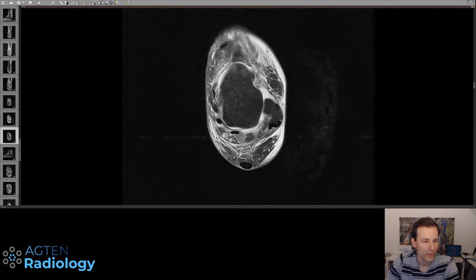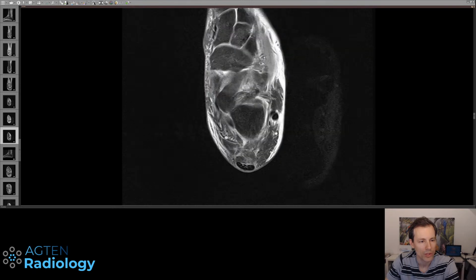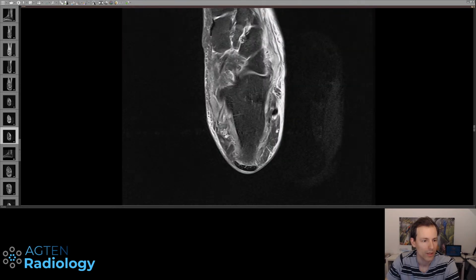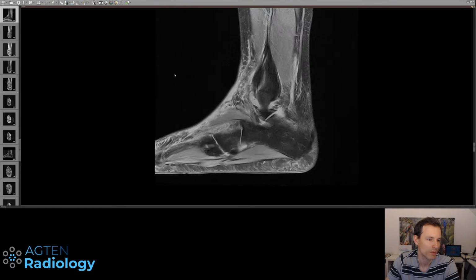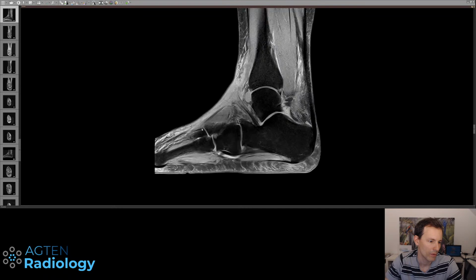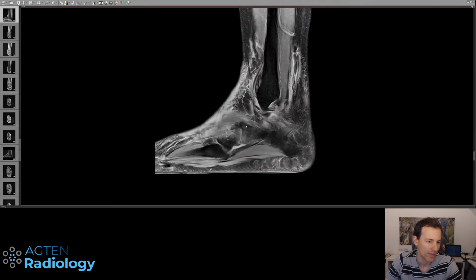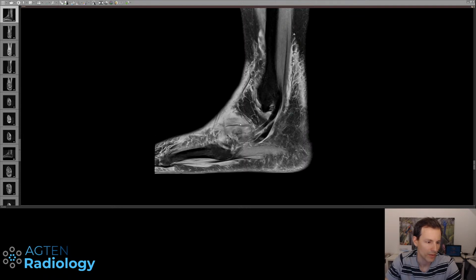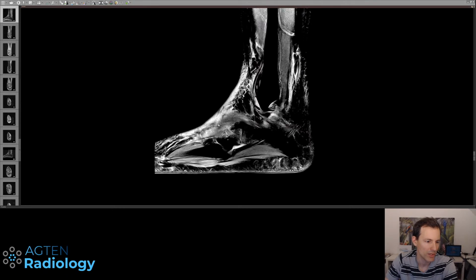One thing you frequently see on most acute ankle injuries is a little bit of edema at the origin of the extensor digitorum brevis. It's not so easy to see here in this case, maybe on a different sequence. The best one is probably this one here. So this is this muscle belly here on the dorsum of the foot. Its origin is at the lateral aspect of the calcaneus, and you can see how we have edema there in the muscle, and even this central tendon slip here looks a little bit wavy when it shouldn't be. It should be pretty straight actually.